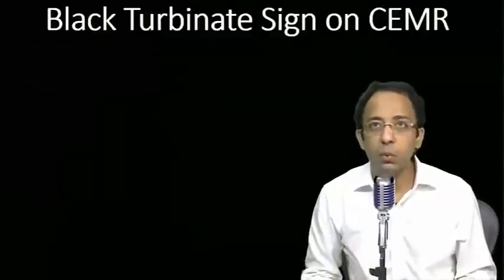That is because of the fungal elements. So are you clear that in fungal sinusitis, you will always have some hypointense signal on T2 weighted image? If that is mentioned in the question, they are trying to point towards a fungal etiology. Okay? Clear? Great.